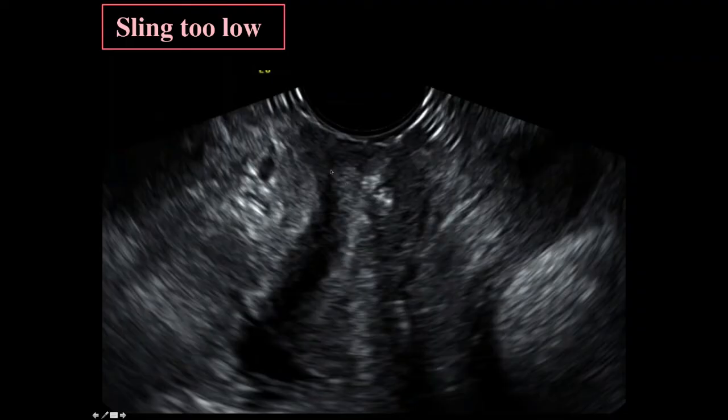This sling is too low. So if you look at the urethra and the vagina, and the bladder, the vagina is back here, the sling should be up in here to hold things together. Instead, it has slid down to within just a few millimeters of the introitus.